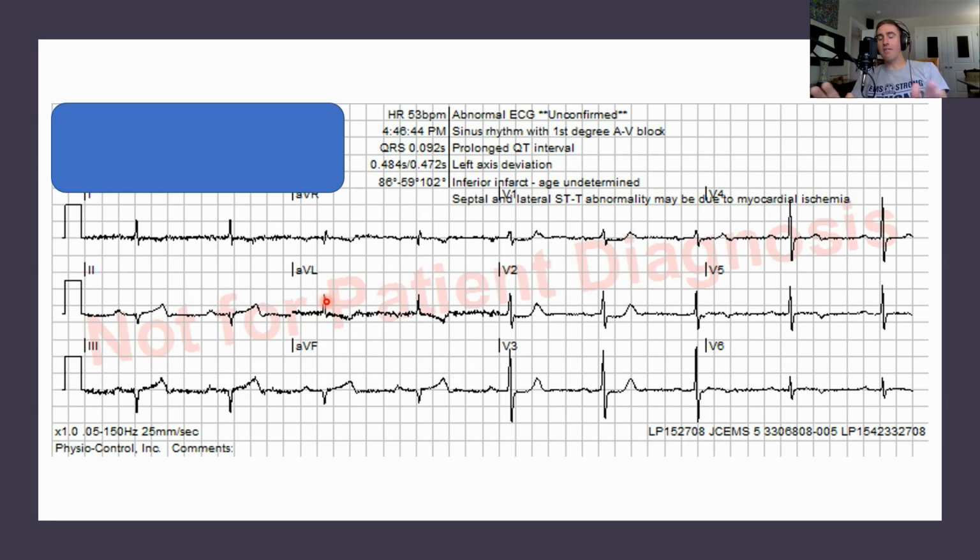If they don't have either of those, then you have to ask why, and you need to explain why there's T wave inversion in AVL. And in this case, the most reasonable explanation is that the patient's having an inferior STEMI. Okay. Now, if you're still not sure, look at the anterior leads, because remember in the past video, I'm pretty sure I said that inferior and posterior MIs generally occur simultaneously and not in isolation.